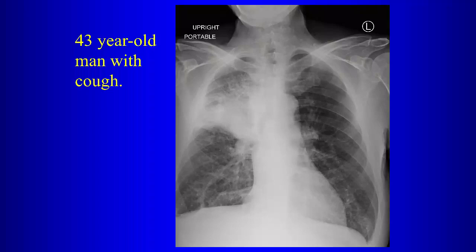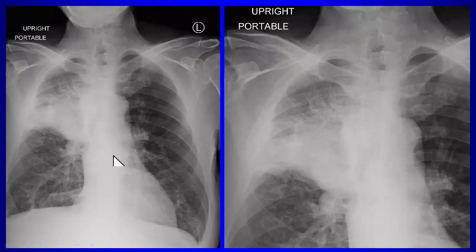There's some volume loss in the right lower. Right lower? No, I mean, if you see, like there's, so I'll give you a close-up. So you're going to send this patient home on antibiotics, or are you going to tell the ER something else? Something's off. What is it? Any cross-sectional imaging. Why? I mean, unless you know the reason why, this patient's going home.